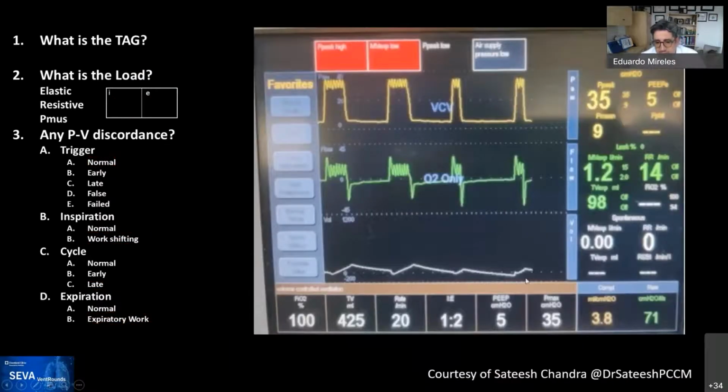This one actually was a courtesy of Satish. He sent this to me on a tweet message, and I glanced at it, and it created a little bit of anxiety. So I put it here for the team to analyze, so that we can go back to the basics on this. So any fellow wants to give it a chance, give it a trial?